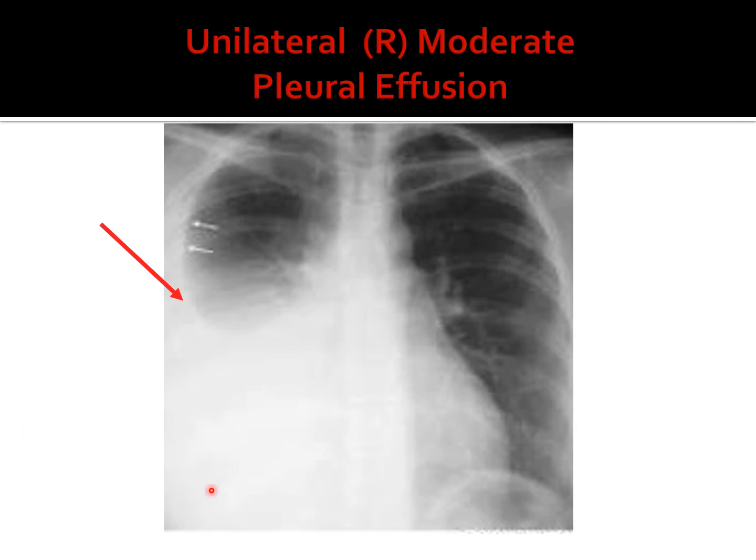Here in this chest X-ray, we see two pathognomonic and very typical signs of pleural effusion. One is the meniscus sign. The meniscus sign is brought about by the increased surface tension of the lungs over the accumulated fluid. That is why it is a cup-shaped or concave deformity. The other one is also because of the surface tension: the lateral side of the fluid is pushed laterally and upwards, which is now known as the Damoiseau curve.